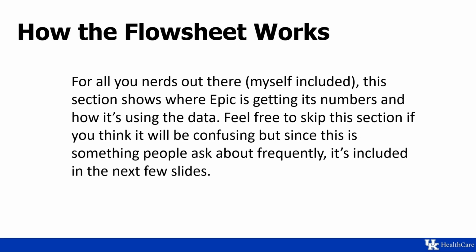For anybody out there who's a bit of a nerd, and I totally include myself there, this section kind of shows where Epic is getting its numbers from. Feel free to skip this if it's a little too much. I think most people probably will find it that way, but if you are a nerd like me, stick around.